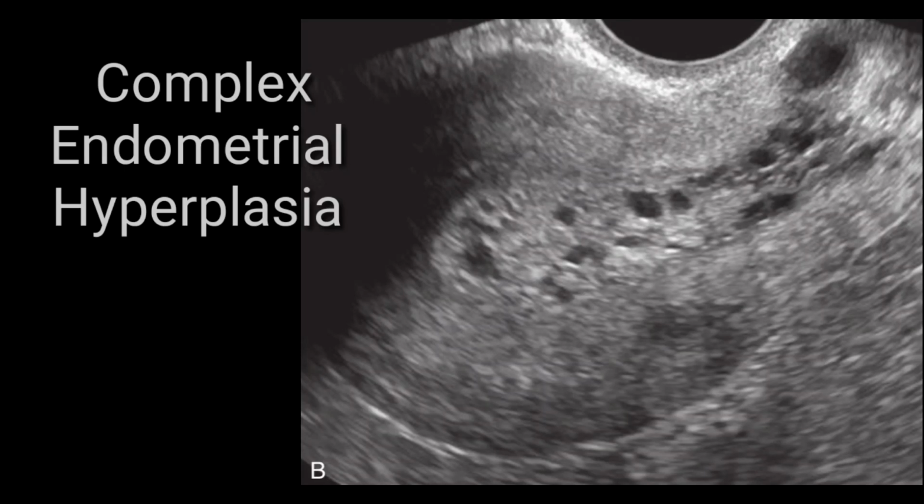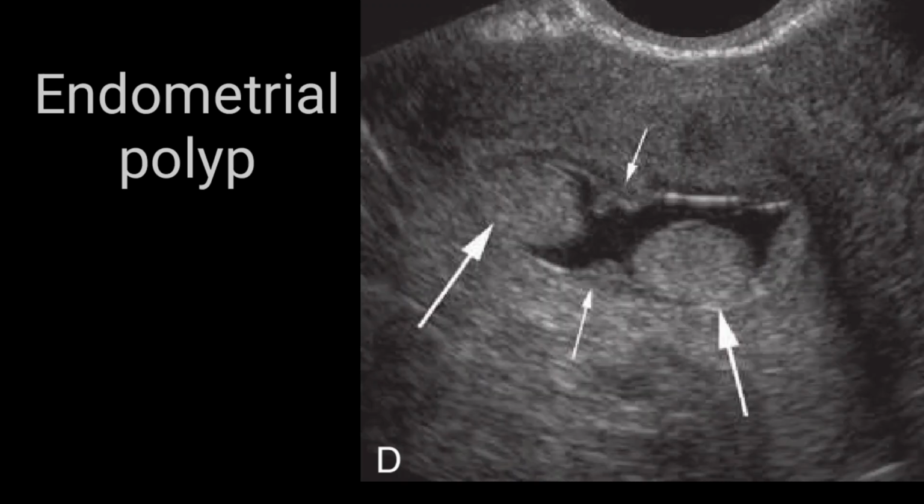So just keep watching. This was just an example of an introductory video for the endometrial abnormalities. Now, this image explains a very common abnormality, and that is endometrial polyps. In the cervical region, I have also discussed the cervical polyp, and sometimes if endometrial polyps get large enough, they spill out from the endometrial cavity into the cervical cavity. This likely happens.